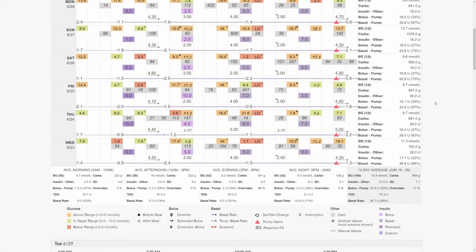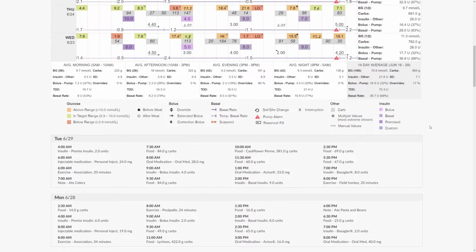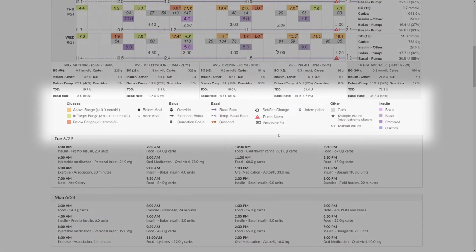As we continue to scroll, you'll see that there are multiple colours, symbols, and fonts. To find out more information about these, we recommend using the legend below.